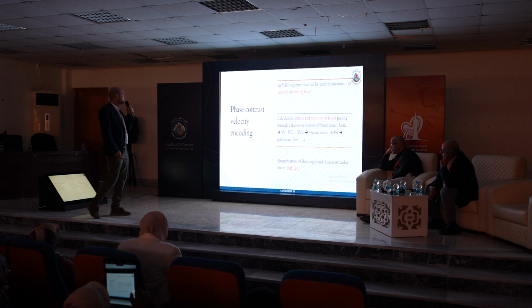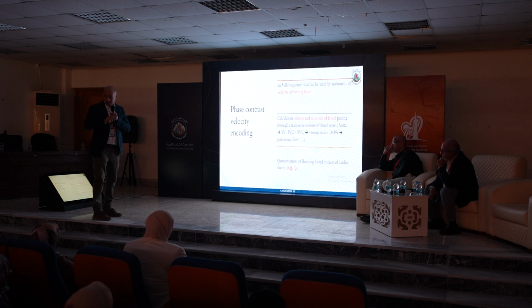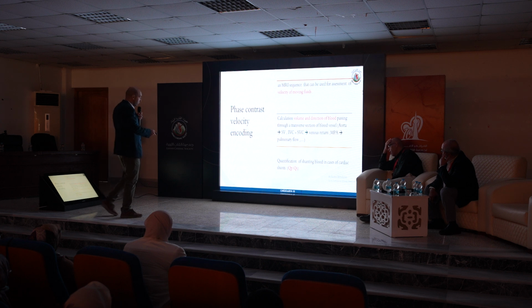The phase contrast imaging, or PC images. It is considered the duplex of the CMR. We use it for assessment of moving fluids: the velocity, the volumes, direction, and for measuring the QP/QS.